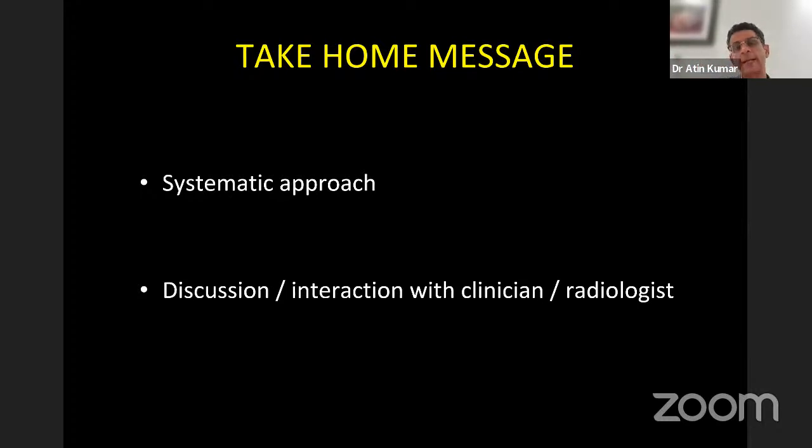I've shown you multiple patterns of HI. I've shown you hypoglycemia, shown you some inborn errors of metabolism, kernicterus, and that's it. One point which I want to highlight here, which was asked by me, asked by Dr. Ashish to tell also, when you're suspecting a HII, hypoxic ischemic injury, whether you should go ahead and do a CT, ultrasound, or a MR.